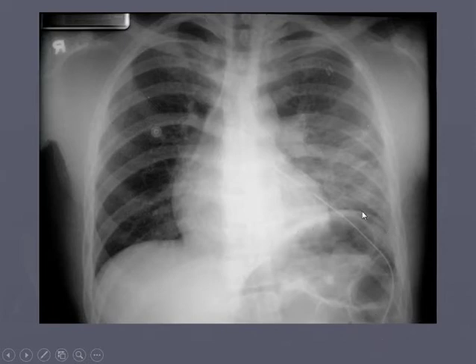When you have air in the abdominal cavity, it will look actually quite thin. And this is the diaphragm right there. Very thin. It's a strong piece of muscle, but it's a thin piece of muscle. So this right up there is the diaphragm. Okay? So the left diaphragm is elevated. A lot of intra-abdominal air is seen over the left diaphragm. So that's something to take note of.